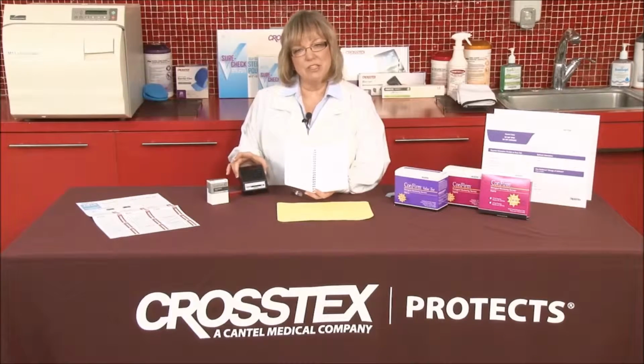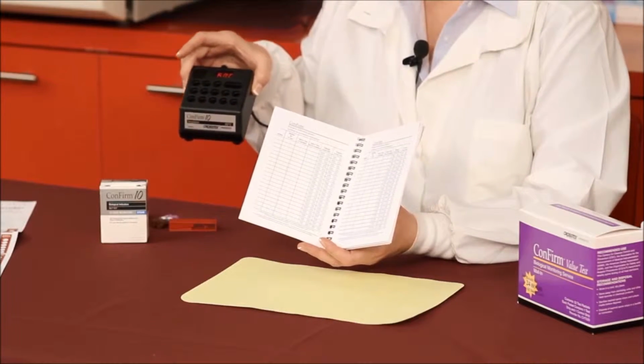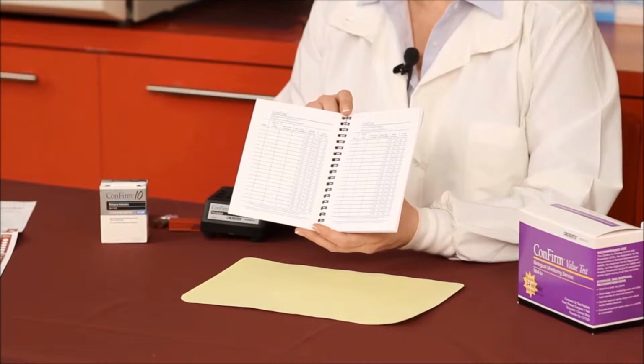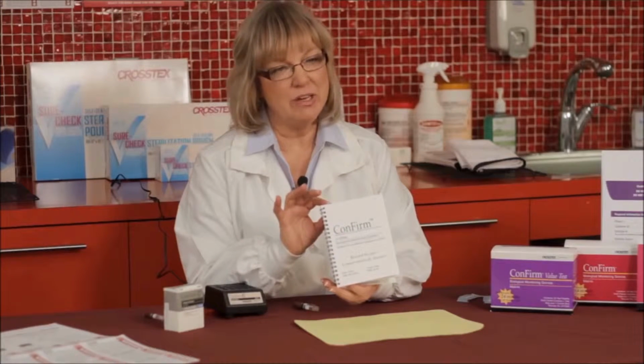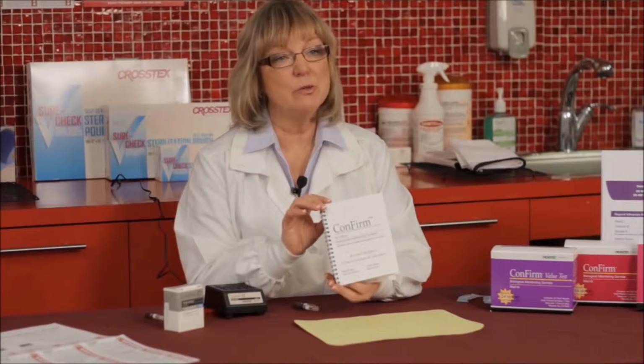So what you've done is you've run your test through your sterilizer. You've then taken both the test and the control, and you've incubated them at the appropriate temperature for the appropriate period of time. Once you've removed the vials from the incubator, you're going to read the test results and record each and every test and control that's run on a weekly basis and keep those records for different periods of time depending upon your individual state boards.